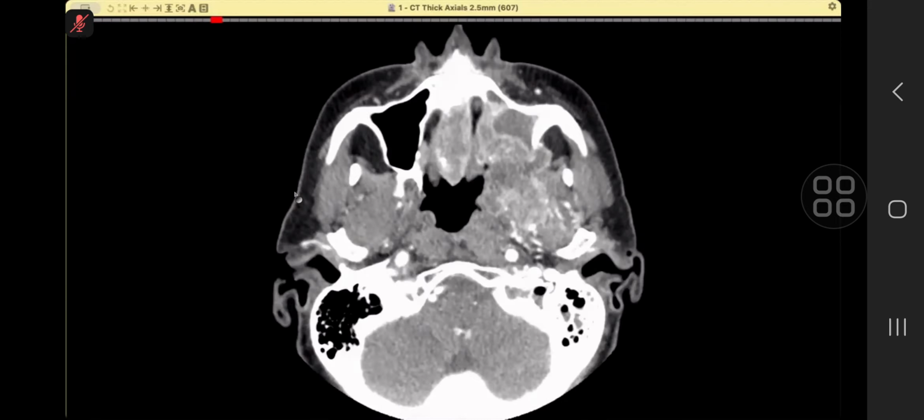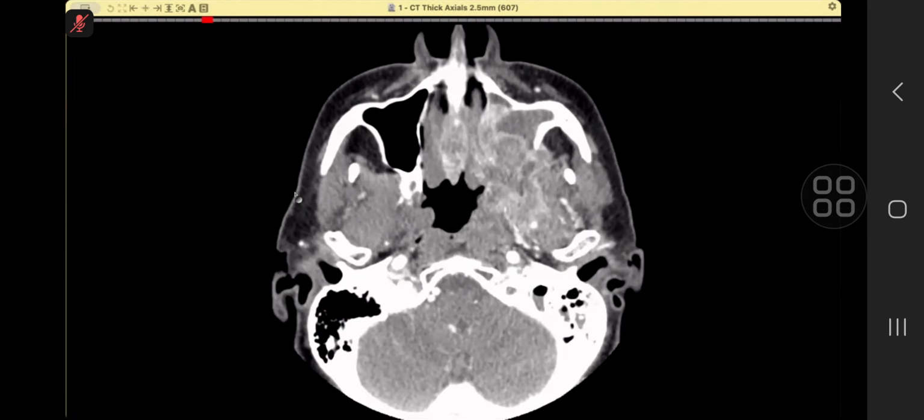The patient had a CT actually next day. Okay. So the mastoid air cells, there is mild left-sided mastoiditis, mild to moderate, and I can see an enhancing mass in the region of the left maxillary sinus, which is causing marked. So let me scroll through the images.